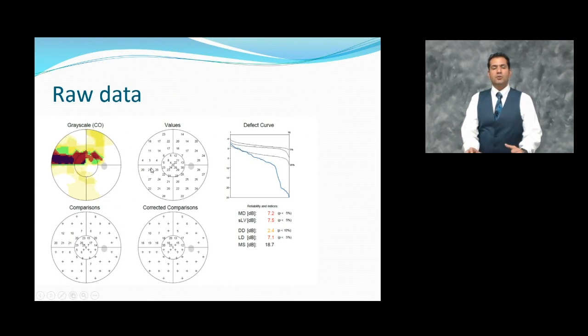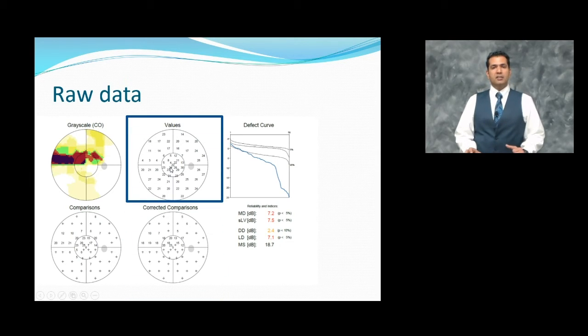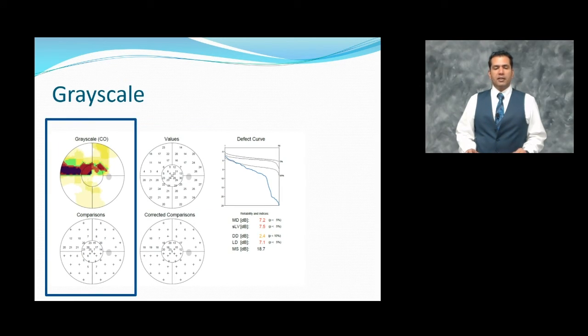Now when you come to the next part of the printout, you are seeing the raw data. The raw data is the most unaltered data from a visual field machine, that is the patient responses, and it's crucial to be looked at. From the raw data, we obtain various other graphics that we will see. Next up is the grayscale. The grayscale is a pictorial representation of the kind of visual field defect the person has.